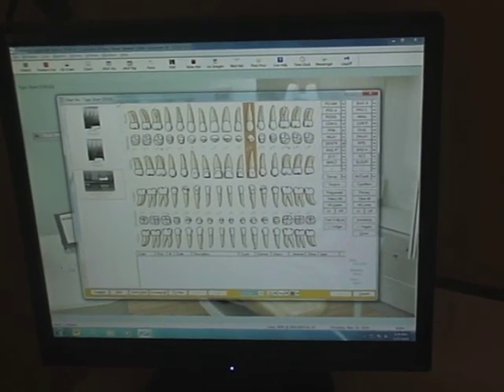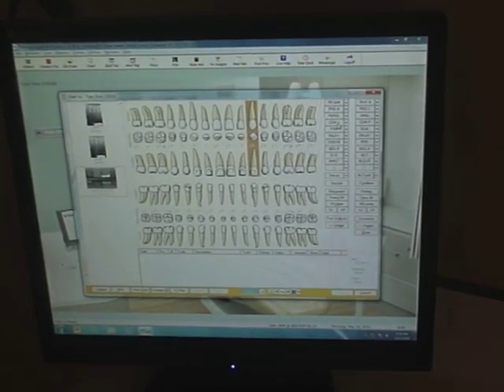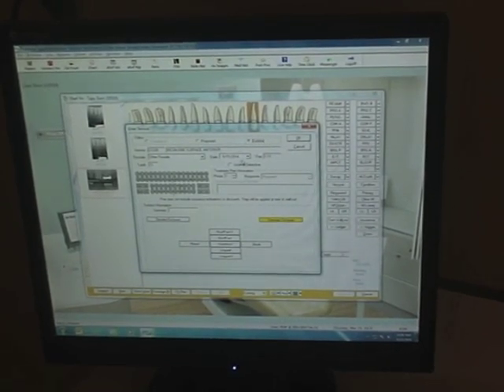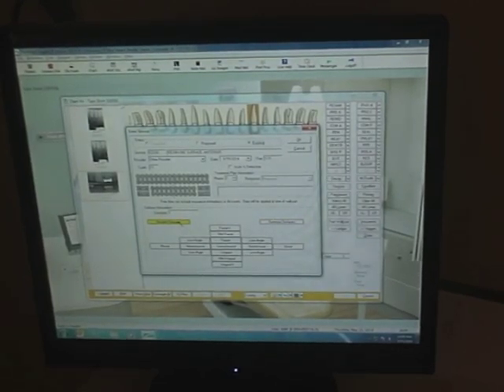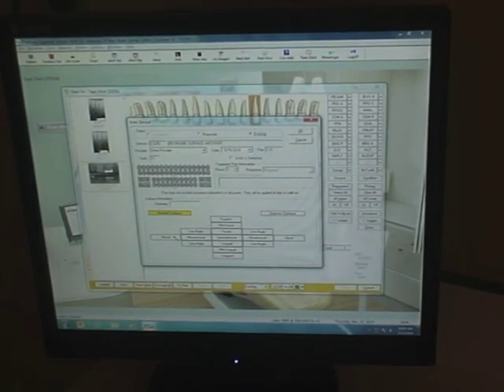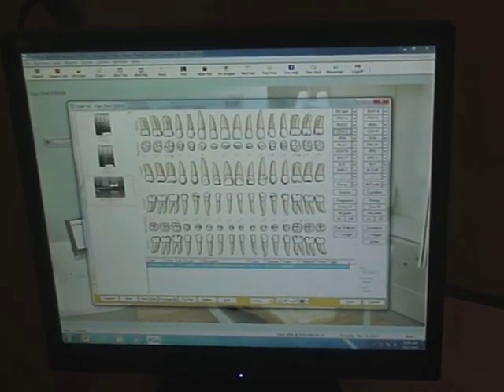After selecting the tooth, we can move on to the COM-A button. COM-A stands for a resin composite in the anterior portion of the mouth. Click the COM-A button. It will show that the restoration is already existing. Go down to Detailed Surfaces, select Detailed Surfaces. Then select what surface the resin or composite is on. For example, you may click Mesial Surface. Then click OK. This will then chart the composite on the mesial surface of the tooth that was selected.